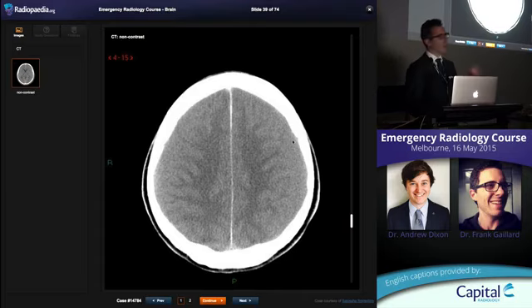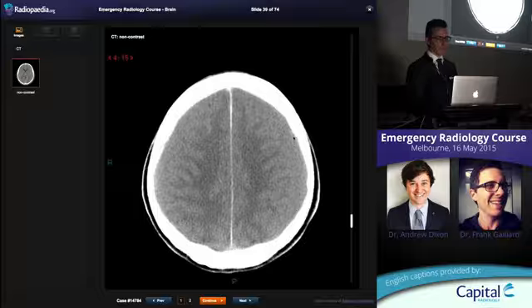The other thing is, even in the youngest, plumpest brain, you should have little triangles of CSF which are pointing down a sulcus. And their base should be on the cortex and they should be pointing down into a sulcus. We're not seeing these at all. So you can make the diagnosis on this.